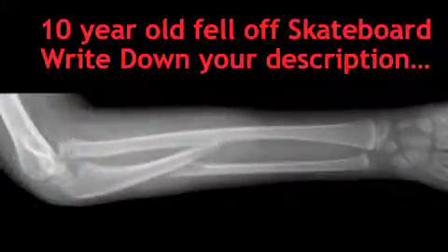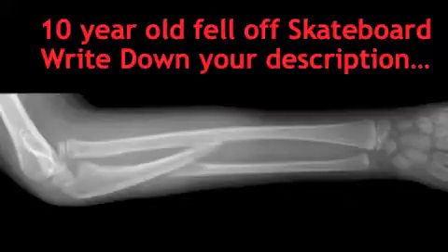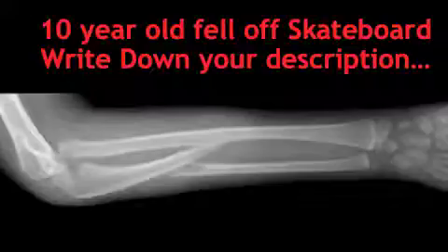So here's another example of a nasty fracture in a 10-year-old. I'll just give you a second to look at this and decide how you're going to describe it over the phone.